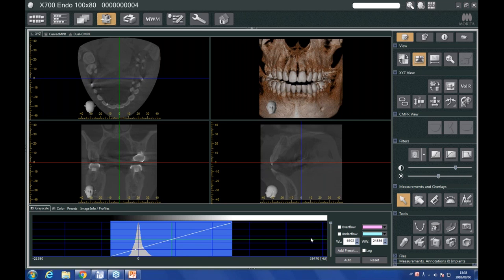Now, the most technically advanced, of course, is to use this histogram window, which you can see here at the bottom of my screen. I'm going to go ahead and switch this over to my log view because I want to see a little bit more detail beyond what the histogram is currently showing me. If I show the log view, I can now see a little bit more detail out here in the left side.